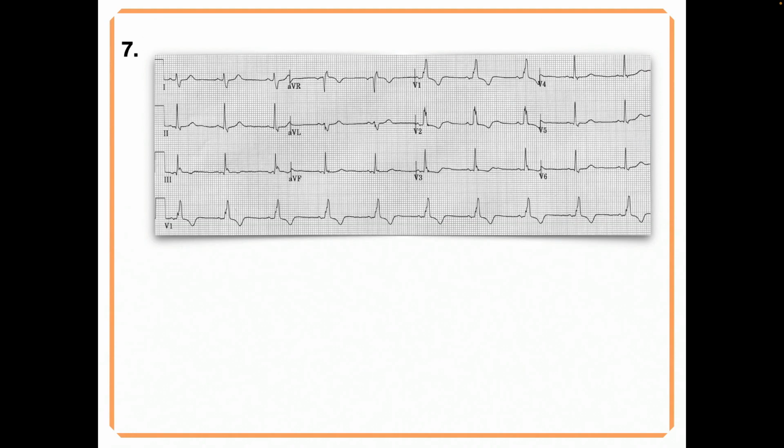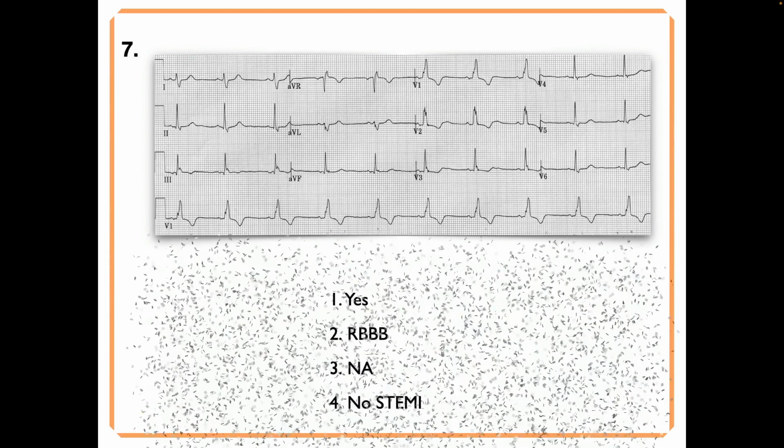Okay, 7, Brandon, it's you. Oh, did you do it? Sorry. Okay, Kyle, sorry. That's a right bundle branch block. Is there a STEMI? Don't forget, with right bundle branch block, you can see if there's a STEMI, and that's that 4th question. No. Okay.